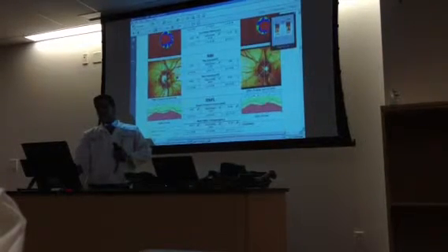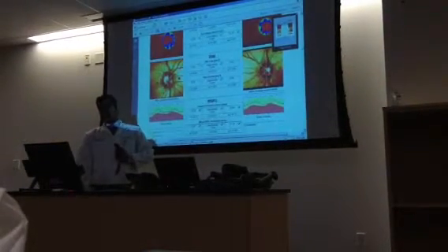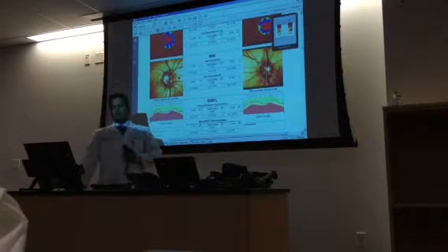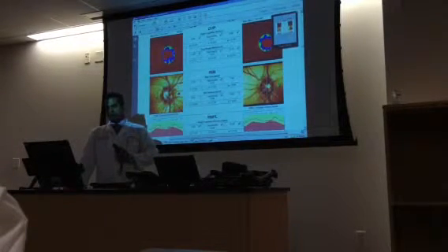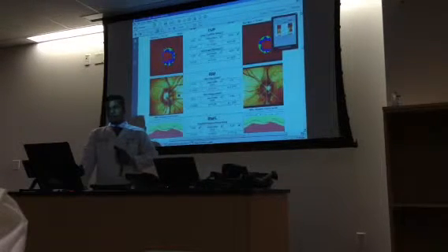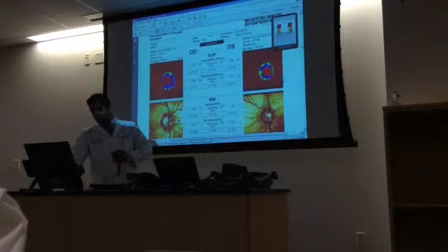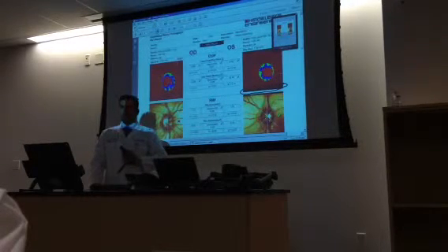Now, I find rim area and rim volume to be much better than height variation contour, as well as mean retinal nerve fiber layer thickness. So retinal nerve fiber layer, I pretty much don't touch when it comes to Heidelberg retina tomograph. Parameters that are very helpful are Moorfield's regression analysis and rim parameters. Cup parameters are also very helpful in identifying a potential problematic case. If you see a black patch like this, as you're seeing right here, it essentially means that the data is not available for that region. That's when you have a black patch.